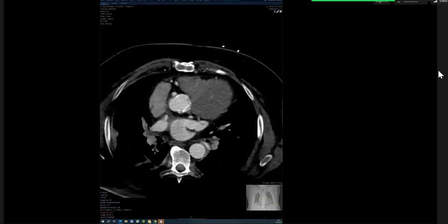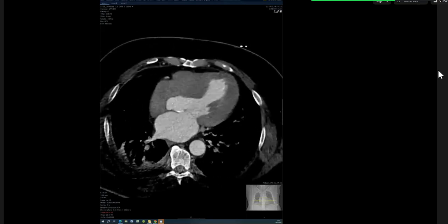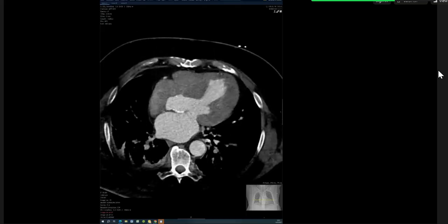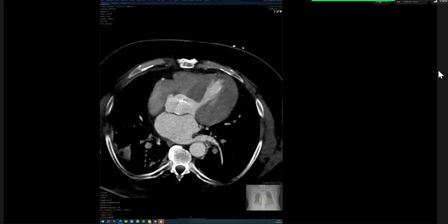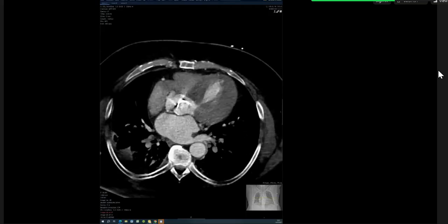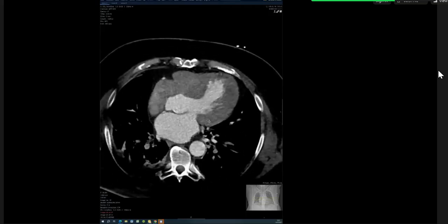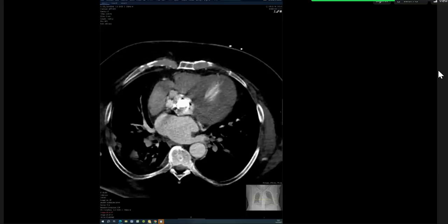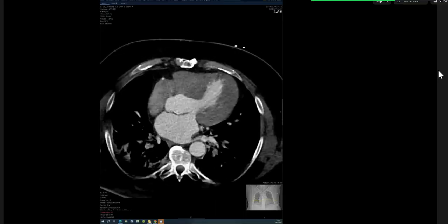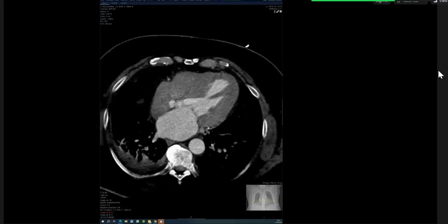So go down axial this way. You see again that this is the aorta. Then you have this pouch coming off it there. So you would describe that. If you pick that, you would say the patient has an aortic valve replacement. There is an irregular appearance to the contour of the aortic sinus. I am suspicious for outpouching.